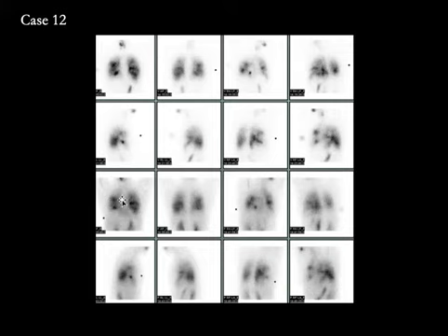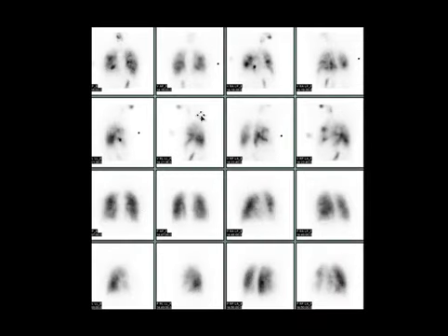And I was telling you before, the DTPA particles are broken down in the lungs and they're absorbed and excreted from the kidneys into the bladder, and that's what we see here. And the perfusion injection was repeated and then the scan was reported, which is seen here. So ventilation is the same. Now look at the pattern of perfusion with a good injection. The perfusion looks better than ventilation and it turned out to be a low probability scan.